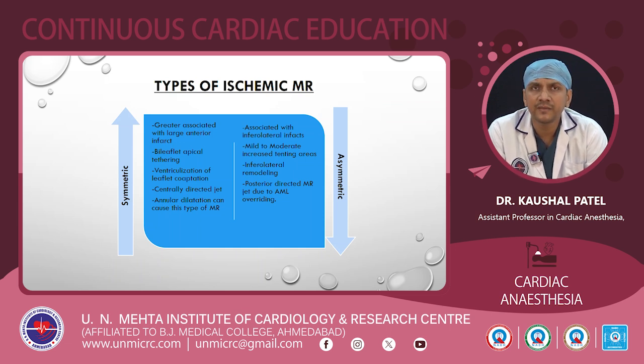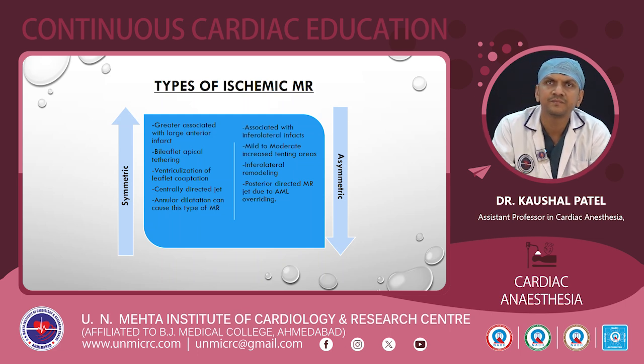Now coming to the types of ischemic MR. Basically, there are two types: symmetric ischemic MR and asymmetric ischemic MR. Symmetric ischemic MR is more associated with a large anterior infarct. It is a bileaflet apical tethering, in which we see a central jet. Asymmetric ischemic MR occurs basically when there is an inferolateral infarct, which can cause a posteriorly directed MR due to AML overriding, because of posterior papillary muscle dysfunction of the PML.